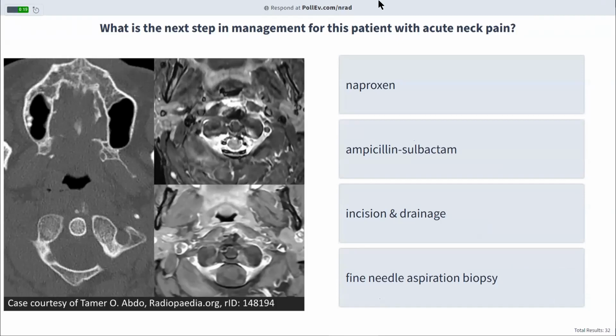So for the prior case, the subclavian pathology was, I don't know, idiopathic. It could be iatrogenic. Somebody had a central line and you poke the vein, and the vein ballooned out, and you have a venous aneurysm or venous varix, whatever you want to call it. So you can either call it a subclavian venous aneurysm or a venous varix.